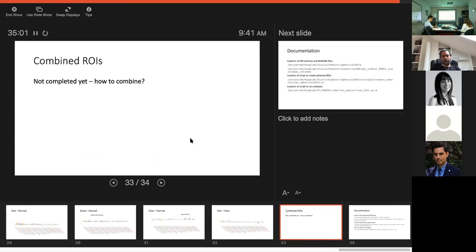One possible way to go about that is looking at the results of the group voxel level analysis. You have this button that allows you to look at individual subject data for those results. So you can use the MNI space group level, voxel level, volume level analysis, and then project those analyses into the individual spaces and look at the anatomy together with the functional activation for each individual subject, and focus on a few slices that look at the subcortical structures that we care about.